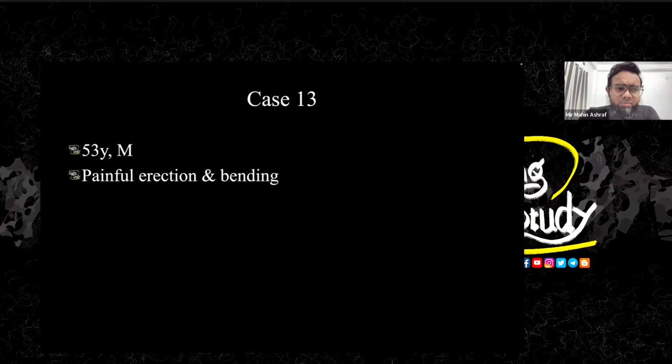So this is a 53-year-old male patient who came with painful erection. Again, penile. I have missed. I think I have just made a mistake. I was trying to take a scrotal ultrasound case, but mistakenly I have taken the penile case.